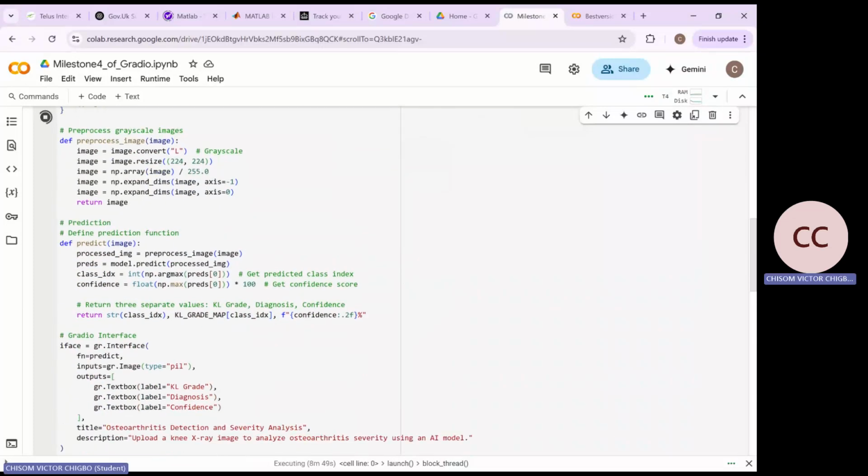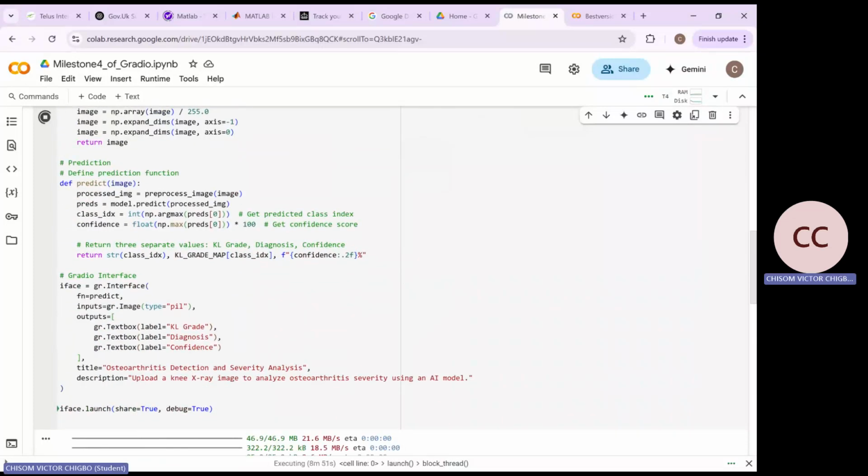So that was that. Then the prediction function, and this prediction function is basically the whole point of this script particularly, to help the model make predictions based off of what input you've given it. Then we return it, then the script will return you feedback.